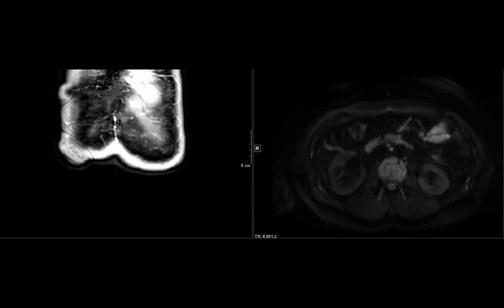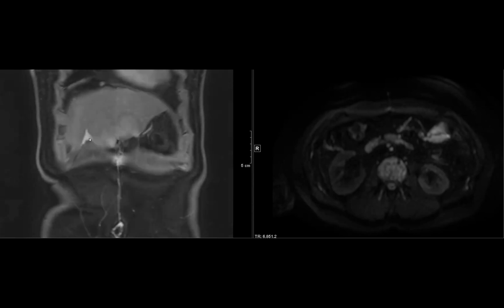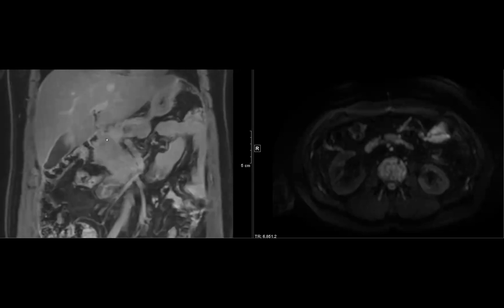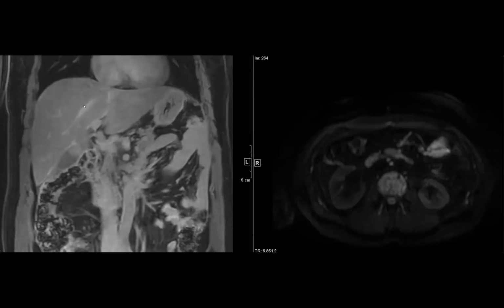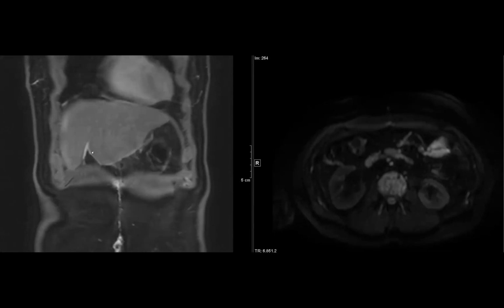Oh, wow. So are you thinking the entire peritoneal lining is involved? Looks like the peritoneal sidewalls are doing the same thing. So, right, I'm pretty sure, I have no other explanation, but to say that the capsule is involved by tumor, right?